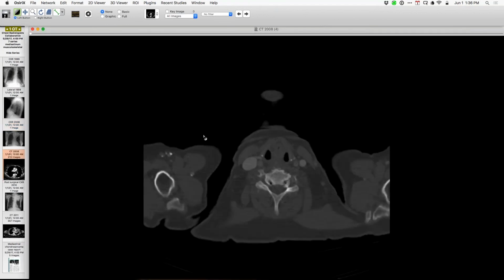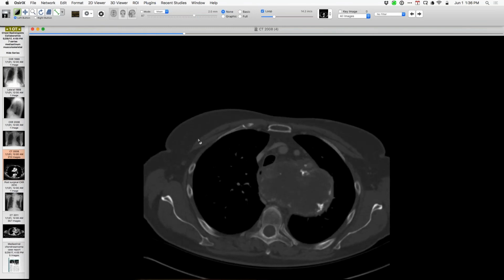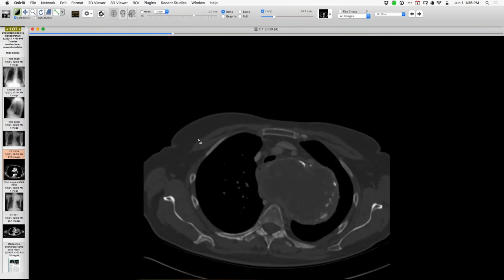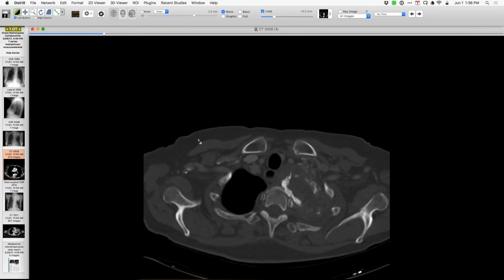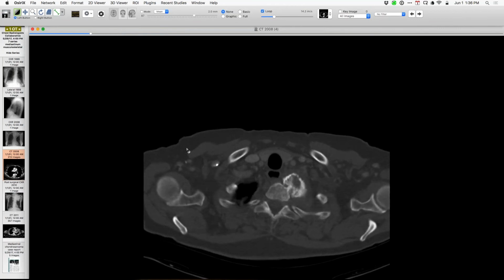Here is a CT from 2008, and you can see the size of it. You can see the nature of the calcium or matrix of calcium and or bone in this lesion. So going to the bone, certainly over here, it's close to the vertebra.